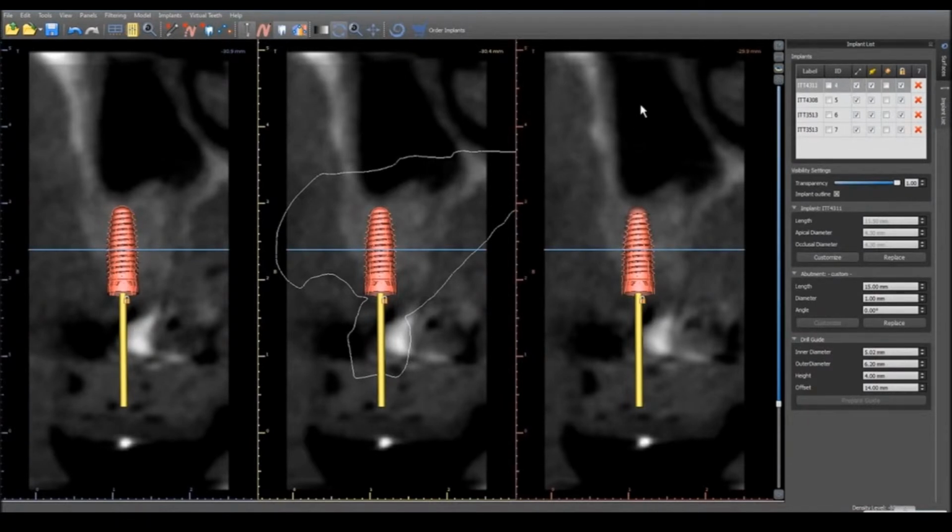So this is the tooth number 4. This is the second bicuspid. And here we have an outline of the temporary bridge. So now I was able to take the implant. Here's the bone. There was a sinus graft done. And I'm able to line it up in the bone and in the central fossa of that crown, of that temporary crown.